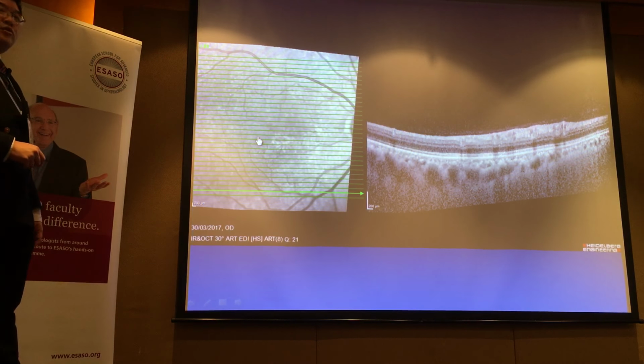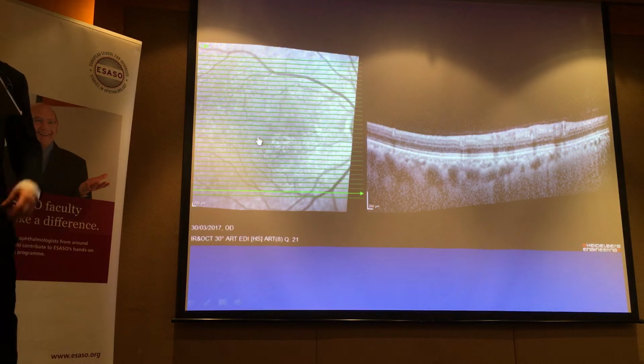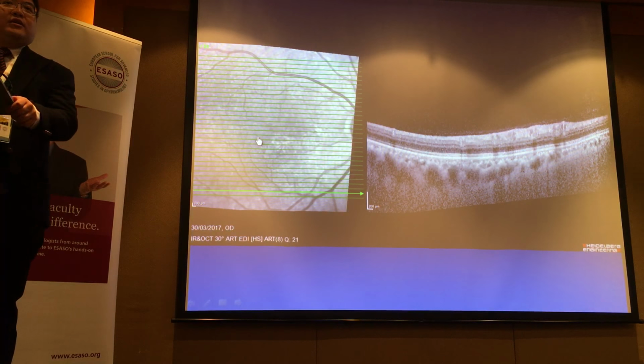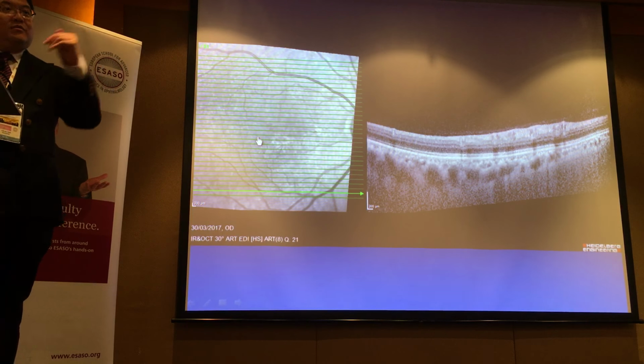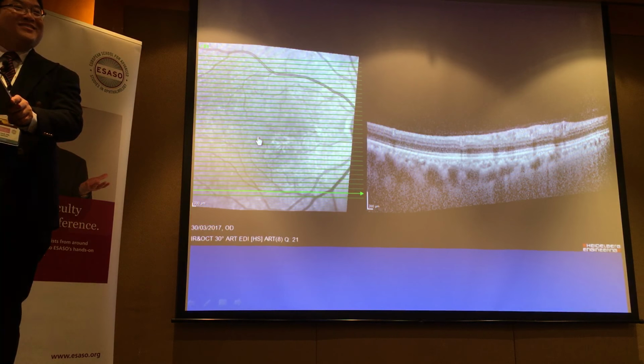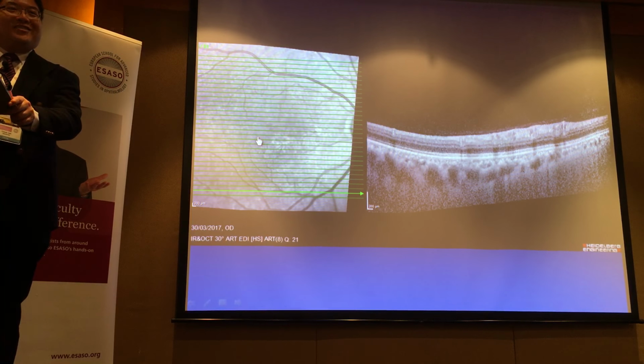So, I saw a patient once with some presumed inflammation, where there was almost at the fovea some mild inflammatory lesion, and on the repeat scan 1 week later, it was considerably down, which was fine, except that we had 2 scans done on that same eye on that day.